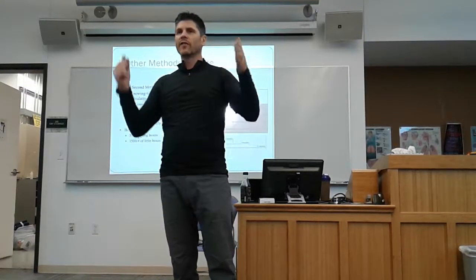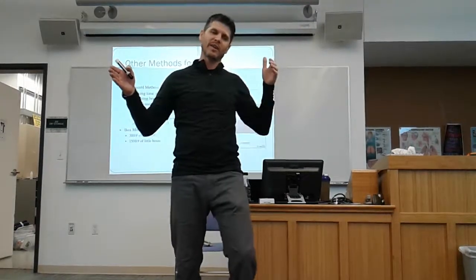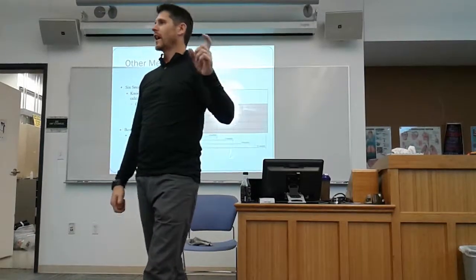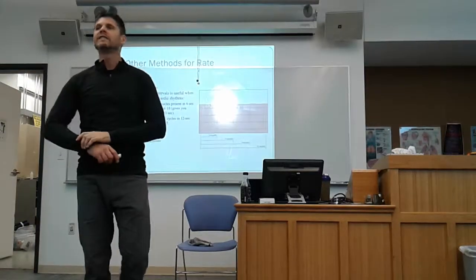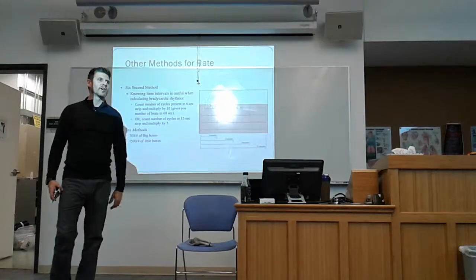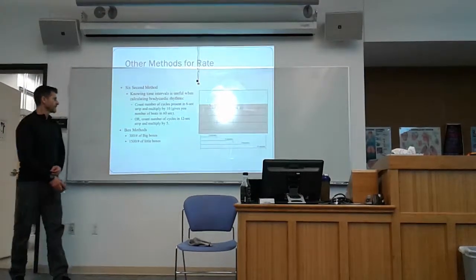And you're never gonna have the second hash mark, the 6-second hash mark, right in that exact spot. So you have to do a little guesstimating as to how far off that happens to be. So it's the least accurate of the methods, but it gives you a pretty fast way of going, okay, well, it's roughly this for right now. Okay. So that's fine.